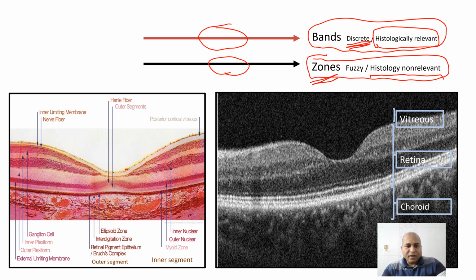And this is one histological image which, although it's slightly schematic, can represent the histology of the retina. And here we have a corresponding OCT image. So you'll just see histologically the structures which correspond to the layers seen on OCT macula.